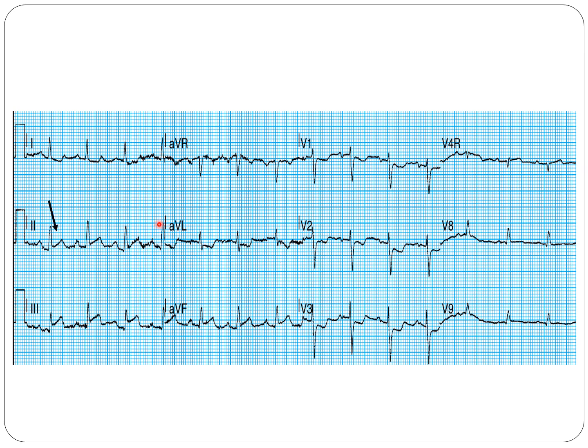Looking at the pathological condition, we see this dome-shaped ST elevation, again in leads 2, 3, and AVF. So 3 is the biggest one. However, you do see again ST depression in V1, V2, V3.